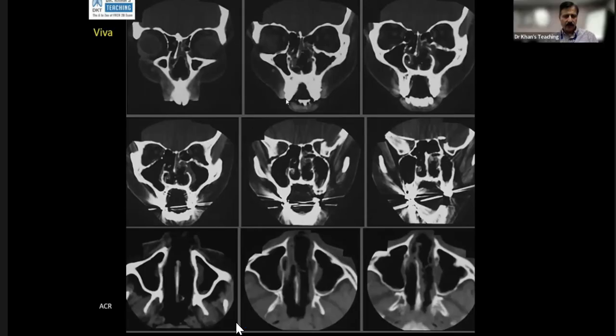Okay, let me take over. If you see here on this CT scan, the nasal septum is destroyed here. It's not present. Now, if you look carefully on this axial, again the same thing. There is crusting overlying this. So basically, we are in a different differential diagnosis. This is septal destruction, very important case for the exam.